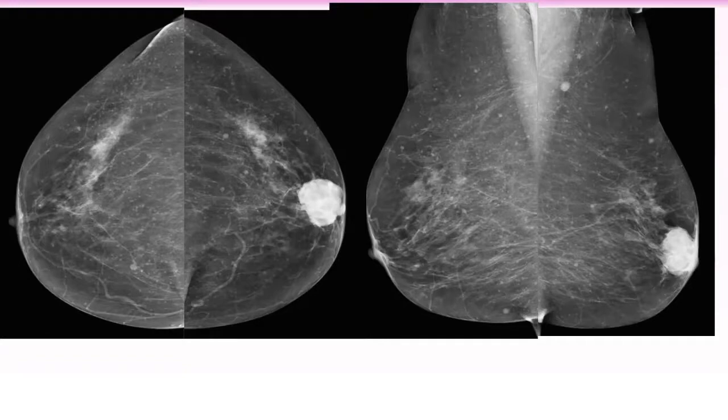Regarding the other diffuse small dense lesions, is it an artifact? No, not artifact.